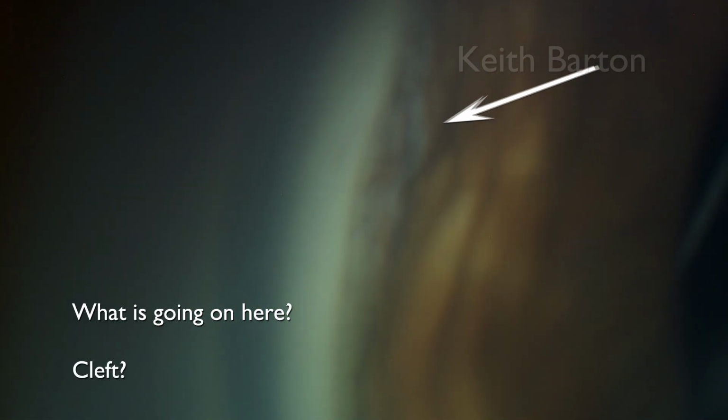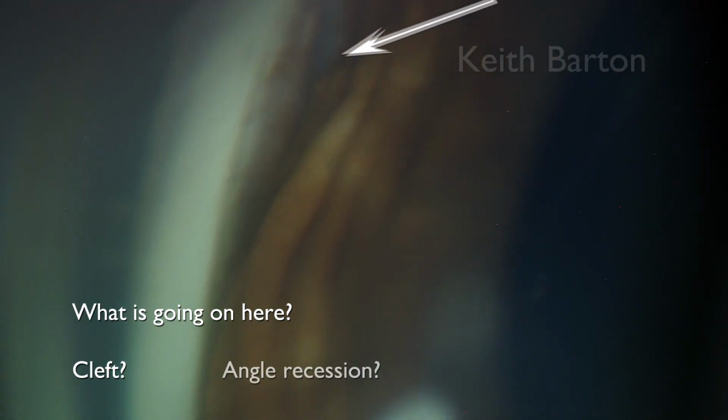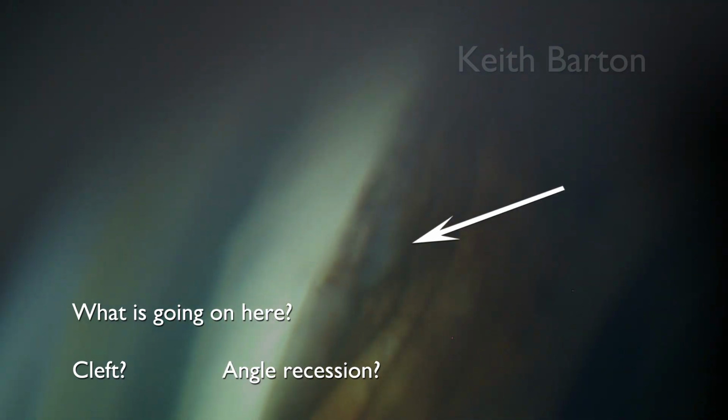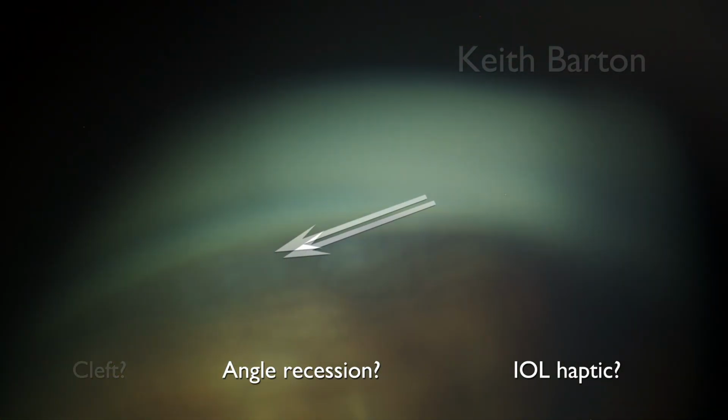Is there a cleft? Is there some angle recession? Is this related to the IOL haptic, or perhaps is it just a red herring?